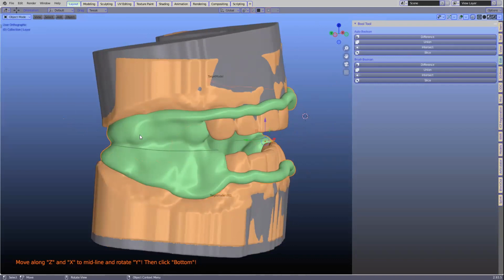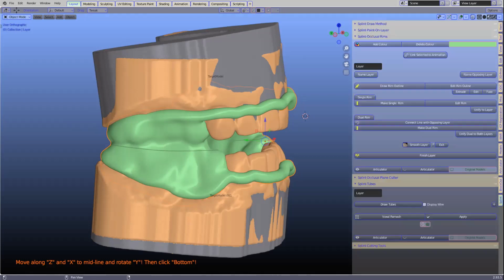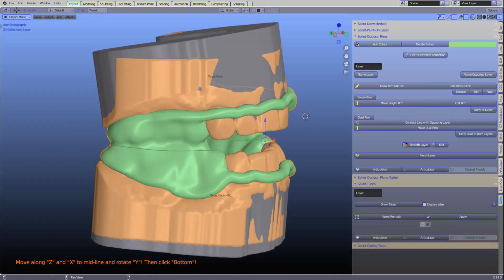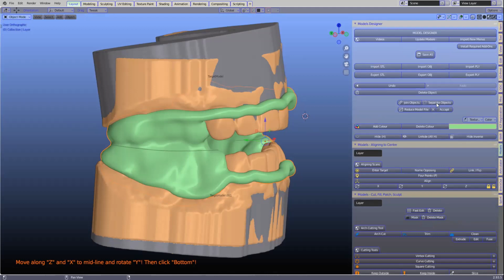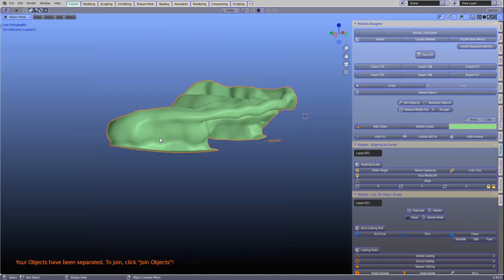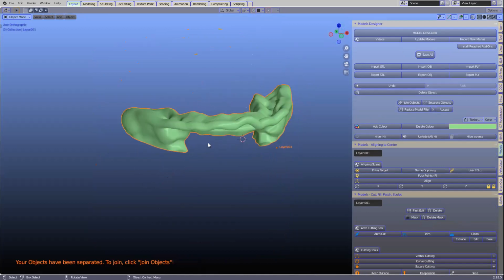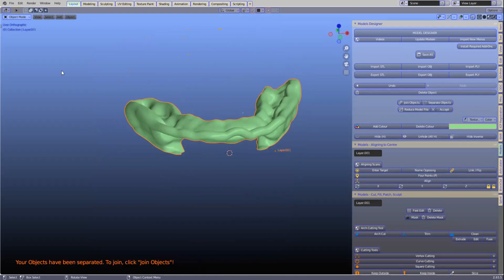Yeah, with the curve of course. Now we've got to separate it. Now you can separate that with any of these other tools. There's heaps and heaps of these separate tools around. I wonder if I can find one. I'll try the model designer. Separate. And we've separated that. And that's actually quite clever. Control I, hide. Okay, so that's according to your Monson and Spee. Yes. Interesting. Very, very interesting.